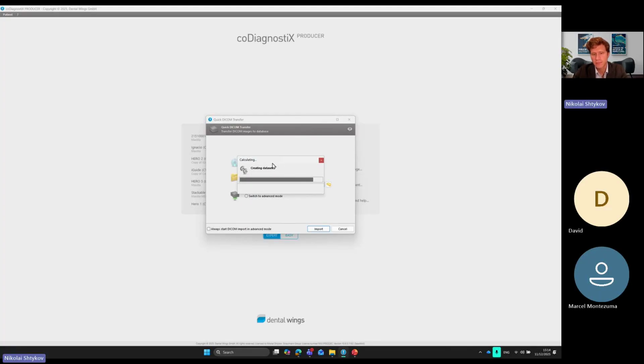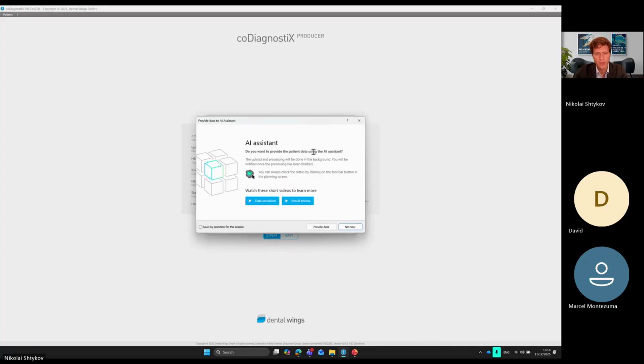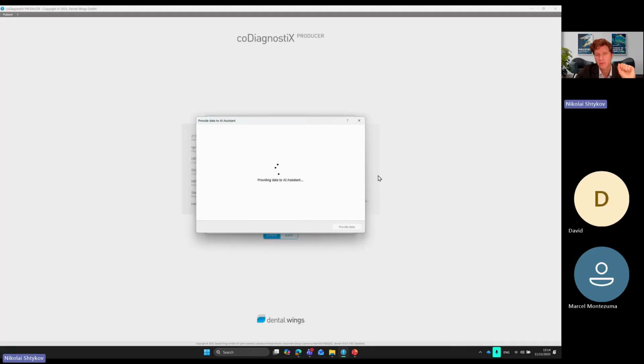System creating the data. And now we have a pop-up. In this pop-up it is important to decide what you would like to do. I would like to use AI assistant, and in this case, I will click provide data. If you click not now, you can use AI assistant also later. Let's click on provide data.